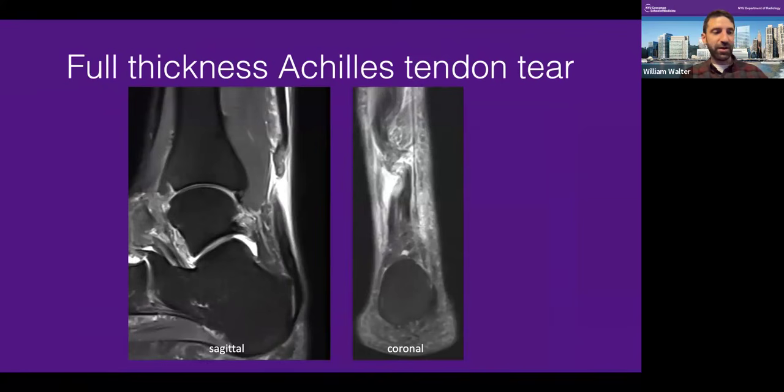When a tendon is degenerated, it can subsequently tear. And so this is an example of someone who has a full thickness tear through a previously tendinotic tendon. You can see that it's full thickness because the tendon is no longer linear or in continuity. So we see there's a fluid-filled gap. That's this bright stuff, all fluid on this T2 weighted sequence. And the tendon ends are barely touching here. There's a little gap in between, but they appear to be pulled back from each other, and there's this laxity, which is kind of the telltale sign that there is not mechanical continuity between those fibers.